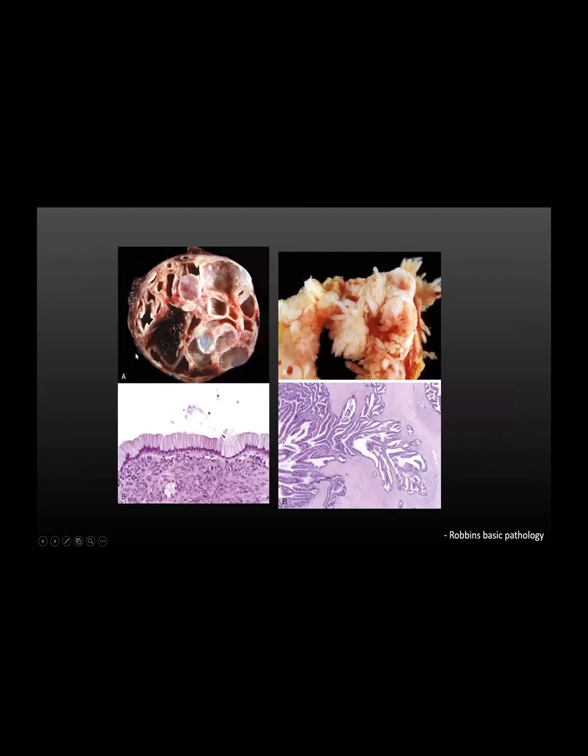And I just found this very interesting, the histopath correlation. Mucinous cystic neoplasms are more well-defined locular lesions, and this is what we see on path. This is the epithelium, and then there's malignancy that has invaded. Again, even mucinous cystic neoplasms will have low-grade dysplasia, high-grade dysplasia, or invasive adenocarcinoma. The path classification is the same for both.